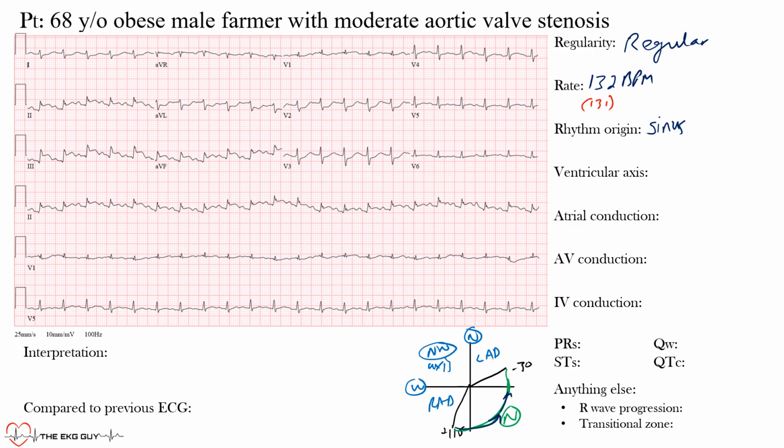That way, if you have someone that has more of a left ventricular hypertrophy or hypertension and you're seeing more of a rightward shift, that should alarm you. Maybe there's something going on. Maybe there's strain from a PE or something that may be causing the right ventricle to have such a dominating force there. Okay, there may be a bundle branch block that is also present.